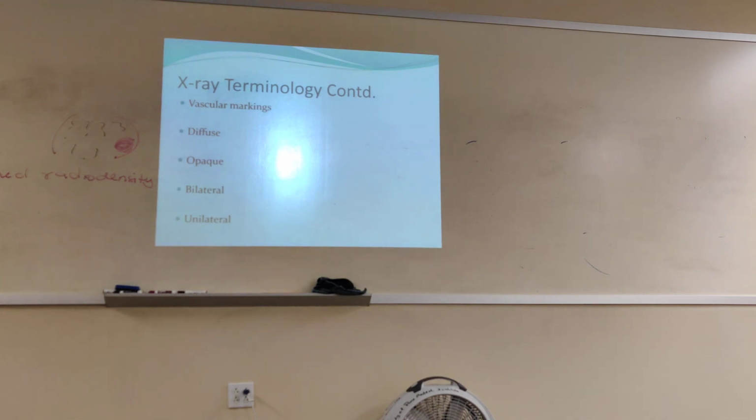Diffuse means all over the place. Diffuse infiltrates. So it's a little white there, all over the place. Diffuse infiltrate. Opaque means white.